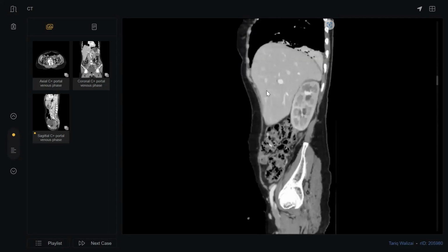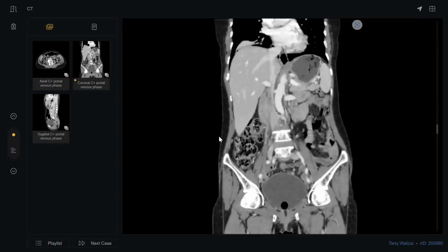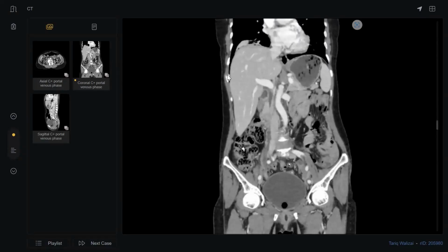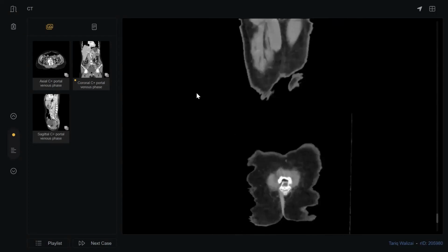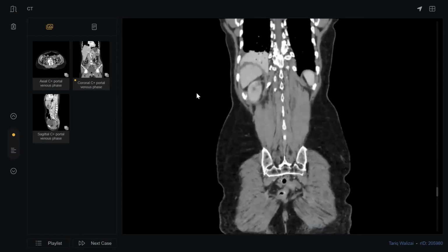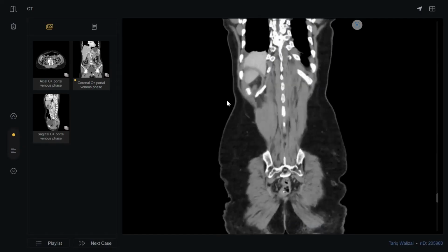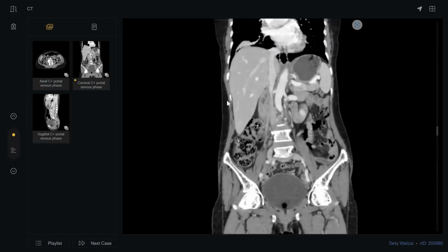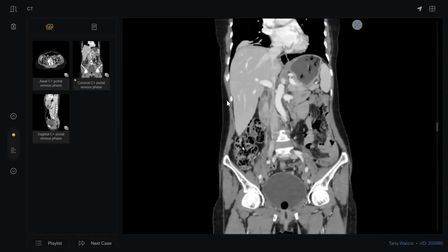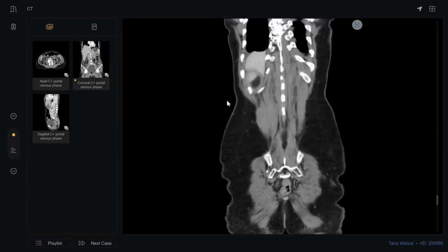This is a fracture in the rib. He has a fracture in the rib. See, he has a fracture here, the 11th rib. This is very important, my colleagues. Why? Because this fracture here will cause him later on a pneumoperitoneum, a pneumothorax, maybe tension pneumothorax. So all of this will at least tell the examiner. If he gives you open window, you are on the safe side.